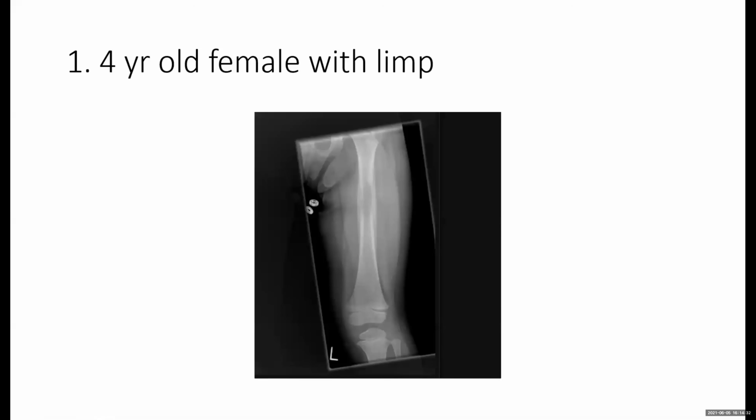Well, it is only acro-osteolysis, but maybe because of these peripheral periosteal reactions, it could be due to hyperparathyroidism or frostbite. I don't know, it is just written acro-osteolysis in Radiopaedia. There was subperiosteal resorption also that Vijaya pointed out. I think it is more with hyperparathyroidism. You are right.